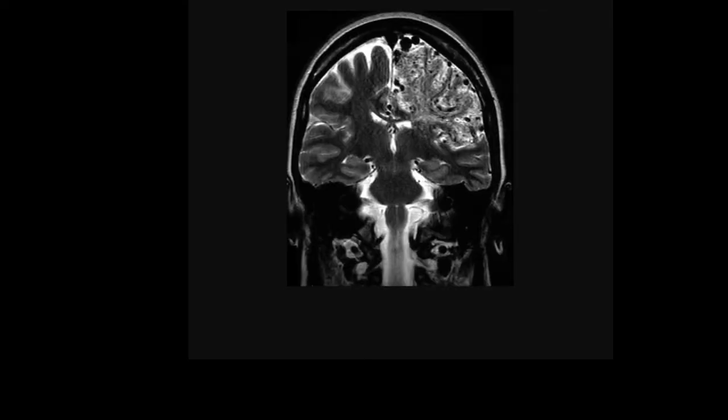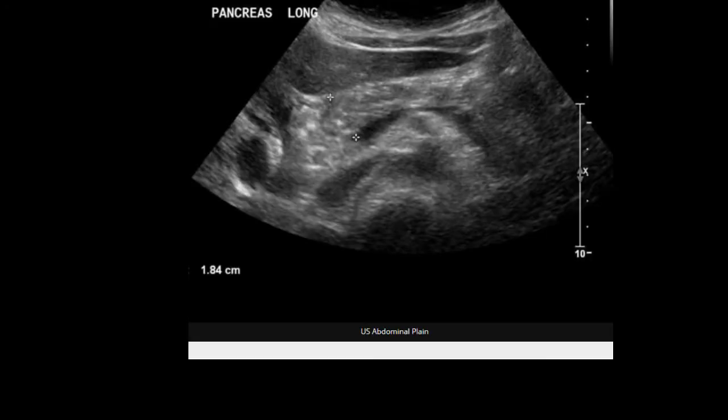The second quiz question I gave was this image, and the diagnosis here is cerebral proliferative angiopathy. So moving on to our case for the day, or case for the video. This is an ultrasound exam, and we're going to go through it.